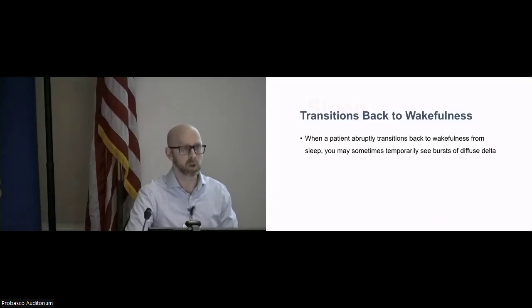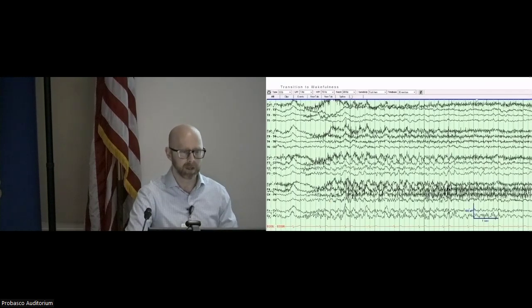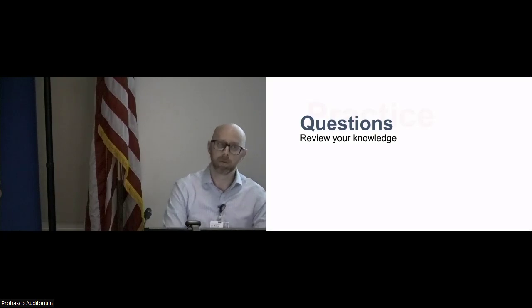You can have some weird transitions back to wakefulness. And this can become a real conundrum sometimes if someone has nocturnal frontal lobe epilepsy and they have very subtle EEG findings to start with. Because sometimes it's just these arousals that you're looking for, and you're trying to figure out, are they arousals with some purposeful movement, or are they seizures? This can be tricky because when you alert, you can get some burst of delta and a reactive phenomenon, a profound alerting response, which is not necessarily abnormal. Sometimes they can evolve a little bit, which can be really tricky. So you sometimes have to correlate the actual state, what's happening, to be sure. But that's something to at least be aware of.